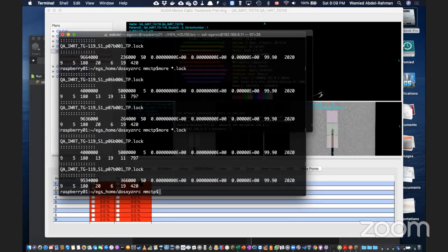Okay, and the 50 is the number of cores it's running. So now I submitted on 50, then. So let me delete this one.